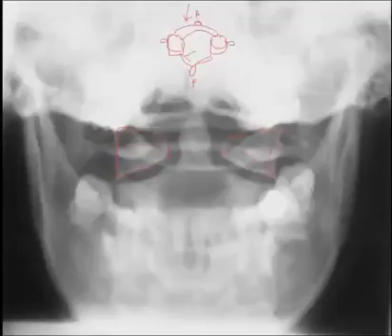Now the lateral masses contain articular facets. The superior facet of C1 will articulate with the occipital condyles bilaterally. The inferior articular facet will articulate with the C2 segment. The transverse processes are visualized extending off of the lateral masses like we discussed in our diagram. And the anterior and posterior arches are also seen.